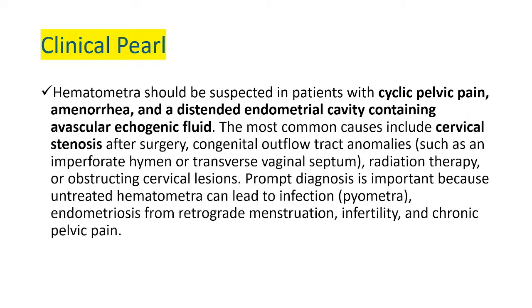Ladies and gentlemen, this is how I write my report. I don't know how you do it. This is just a simple report.